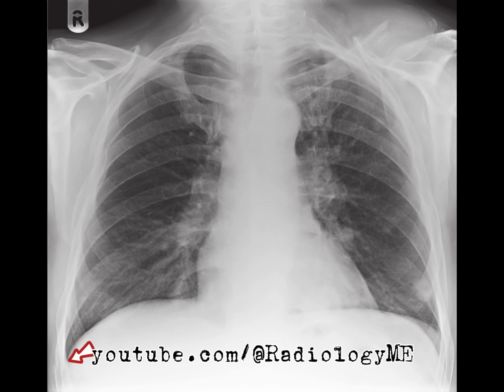So when I pull all of these findings together, multiple pulmonary nodules, a bulky left hilum, and bony destruction of the clavicle, the most likely explanation is metastatic disease. Specifically, I'm thinking about metastases to the lungs, hilum, and skeletal system. The absence of the normal hilar structure really points towards metastatic lymphadenopathy, and the clavicular destruction, along with the nodules, aligns well with metastatic skeletal involvement.